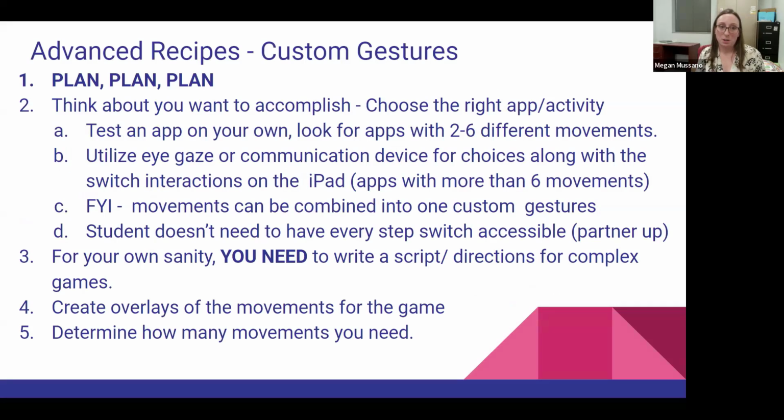Okay, so if you are going to do some custom gestures and recipes, and this is the really fun part, you really have to plan ahead of time and think about what you want to accomplish. Like choose the right app and activity. You're never going to be able to make every app completely accessible. So sometimes just pick and choose.